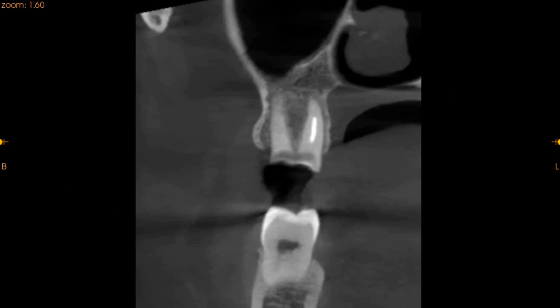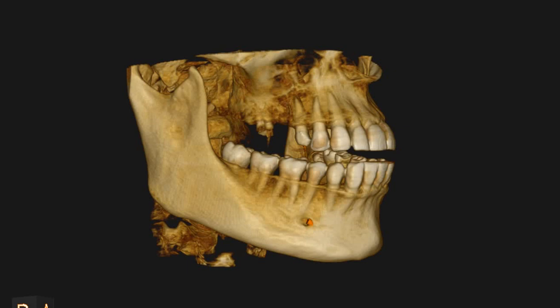Now, to place the implants, I'm going to move on to the 3D rendering. Here you can clearly see the first and the second implant. The first implant is going to be a 4.1 by 10 millimeter implant in the region of the 6, and the second implant is going to be a 4.1 by 11.5 millimeter implant. A millimeter higher or lower and slightly narrower implants can also be used, but this is the ideal: a 4 to 4.3 millimeter diameter and approximately 10 to 11.5 millimeter height implant can be placed in this region.